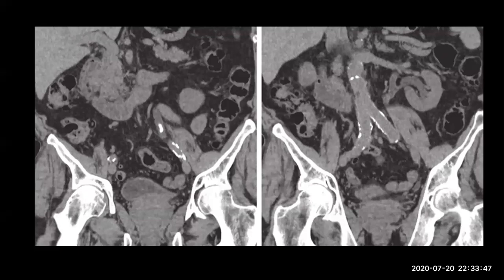I will help you. Hypertrophy of the prostate. Okay. Any other things?